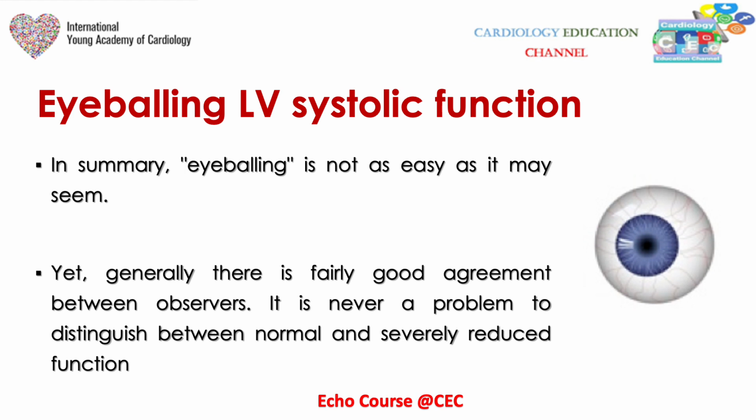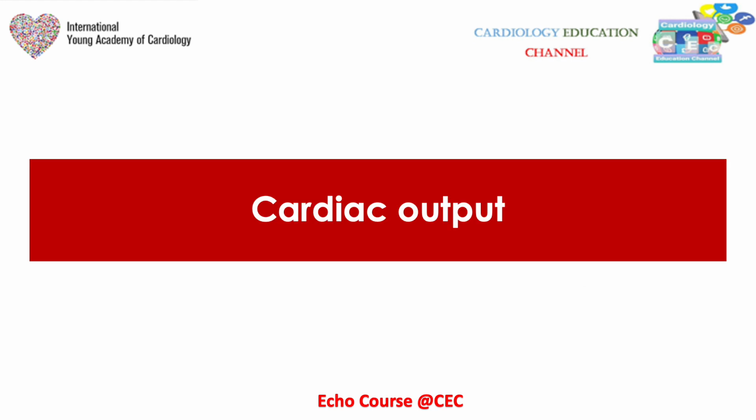In summary, eyeballing is not as easy as it may seem, but generally there is fairly good agreement between observers, and it's never a problem to distinguish between normal and severely reduced function. You only fall into difficulty if the ejection fraction is mildly or moderately impaired.